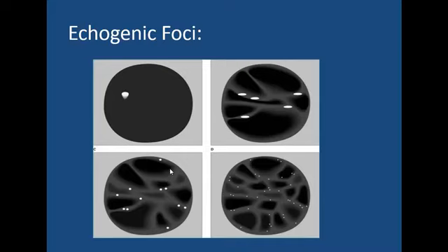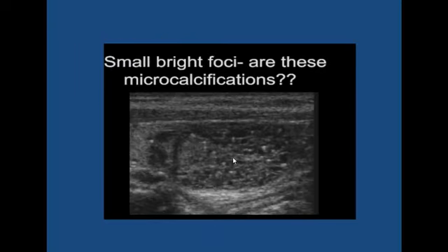Macrocalcification and peripheral calcification were clear. And for punctate, either like this or like this, you will give it 3 points. So the question will be, is this real calcification or not? If we concentrate, we'll find that we have a large comet-tail artifact in all these echogenic foci.